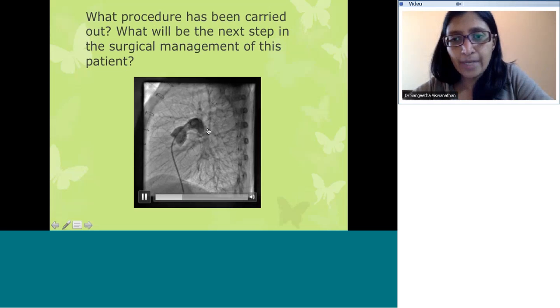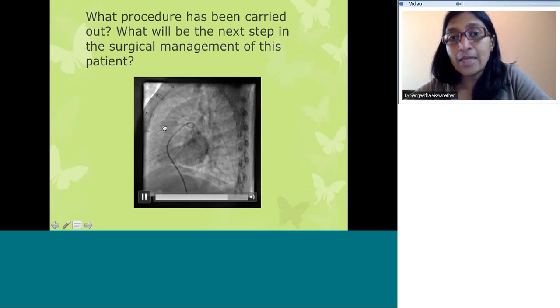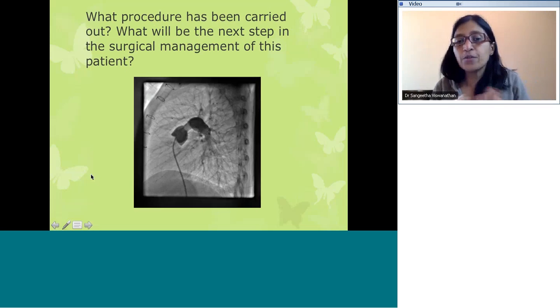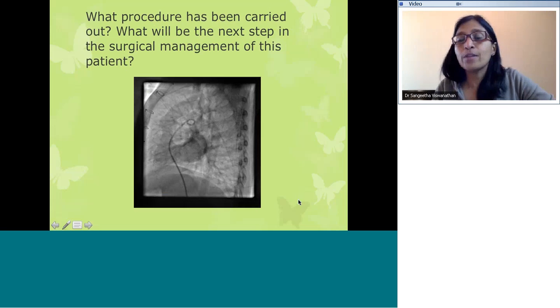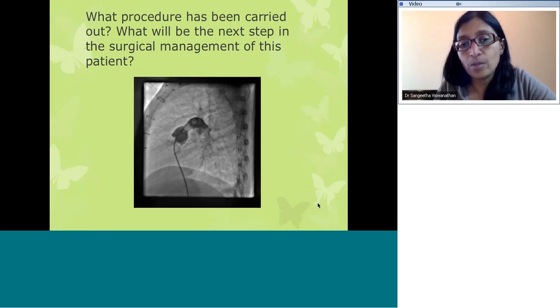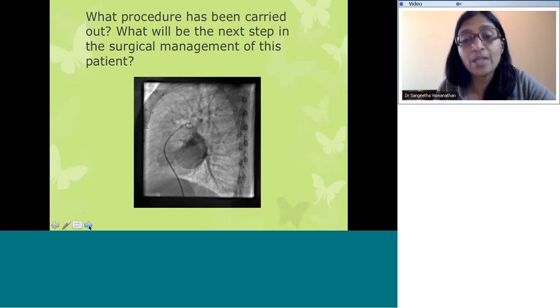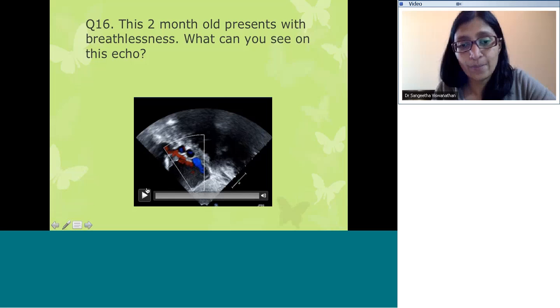These are the pulmonary arteries, right? Yeah. So PA banding has been done in an attempt to train the LV. So in preparation for a double switch operation. And this is usually done when there is tricuspid regurgitation, which is either new tricuspid regurgitation or worsening tricuspid regurgitation. It's an indication for a double switch operation in a patient with CTGA.